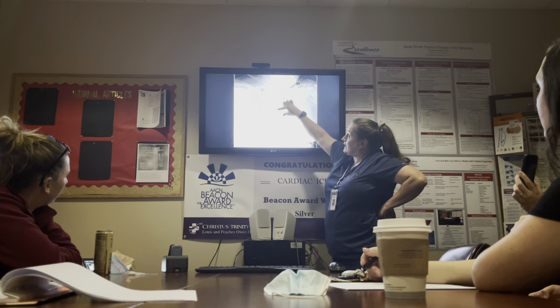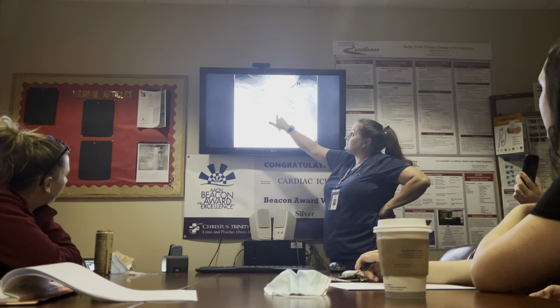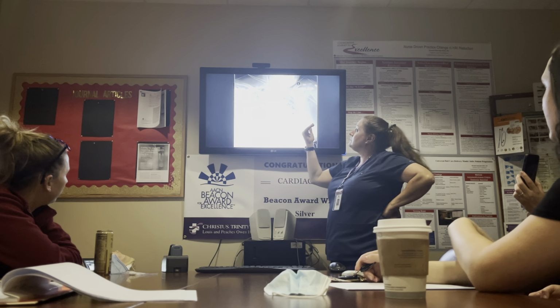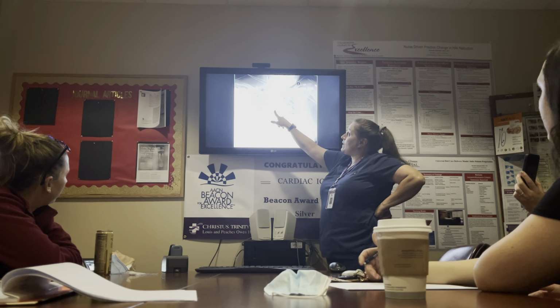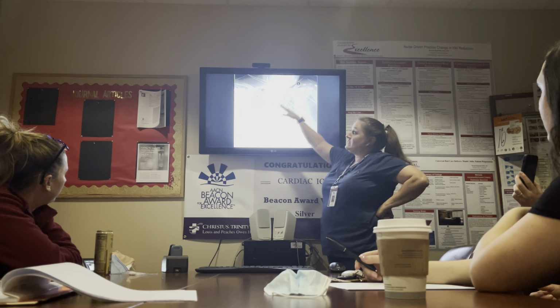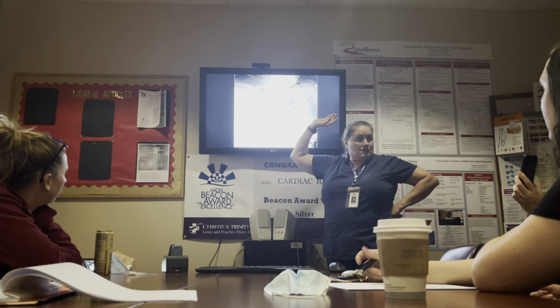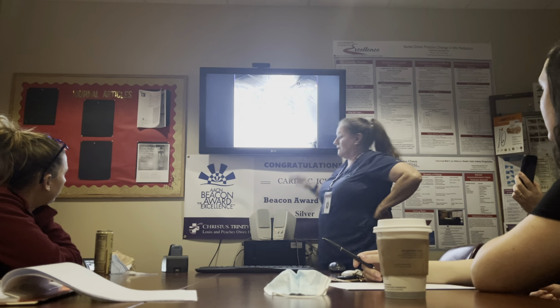You can see it inflated, because normally all you're gonna see is the line, but when they catch it inflated, you'll see the air around it, okay? And this is not wedged, but this is in the proper spot, okay? This would be the time that I would get called, because look at how awful their lungs look and everything else looks kind of crappy too, okay? All right.